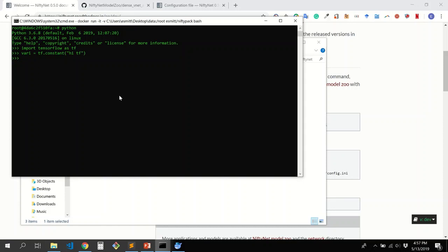This will be very nice. Also the sessions, in this session, exactly. Okay, I am using the CPU support instruction that I compiled to use. Okay, that's some error about my configuration here, but you know that you can use this without problem here.